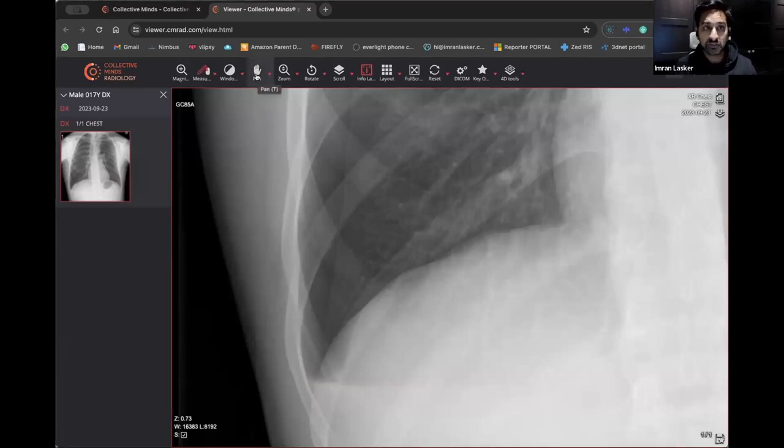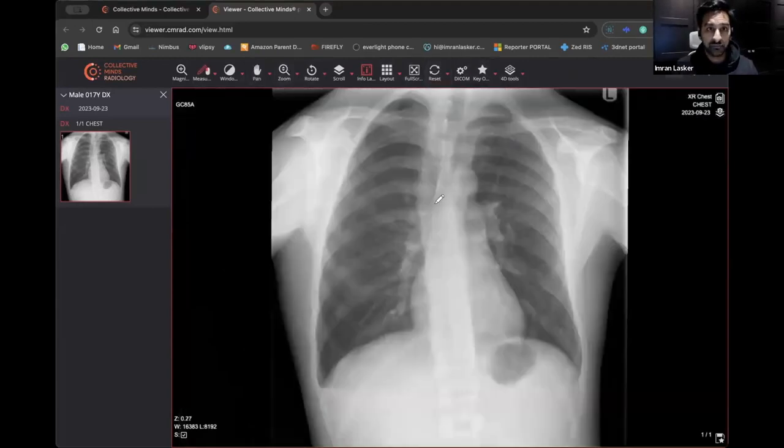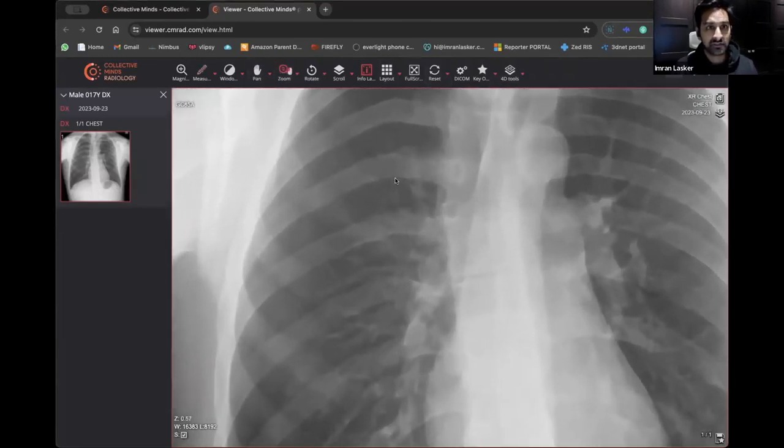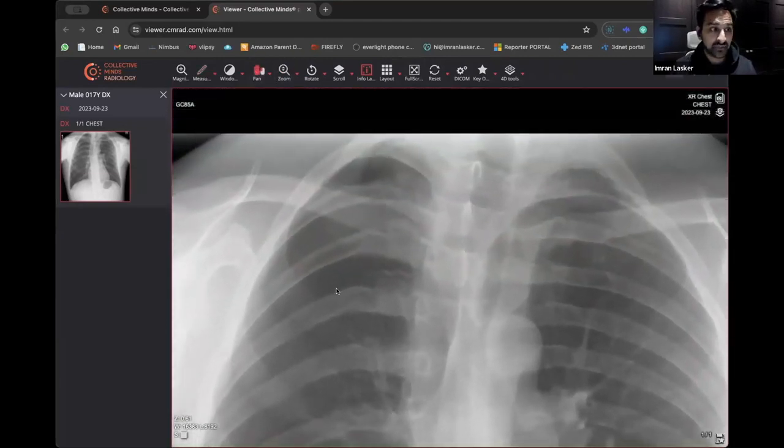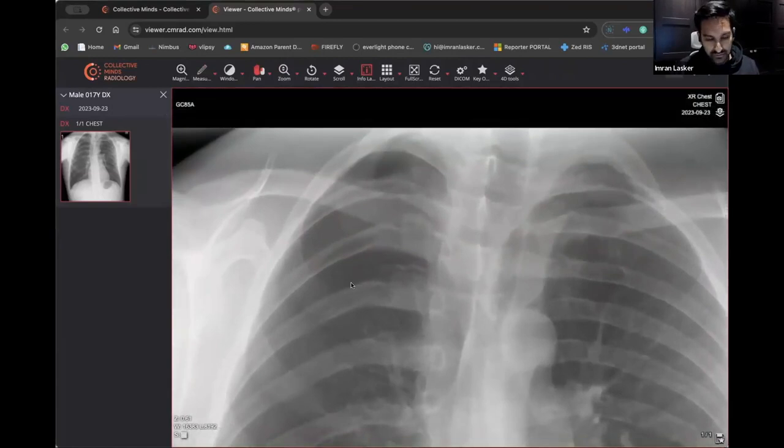So what could that mean? It could mean that they've had a bit of a traumatic injury. That could mean that they had a rib fracture of some sort, which can puncture the lung, and they could have bled. And that's when you really have to do the hard graft and start looking at the ribs. You're going to get hemorrhages as well. So you can have nodules, like a lung malignancy, that can bleed. And in theory, there could also be weak points where you could have a pneumothorax. Not very usual, but it could happen.